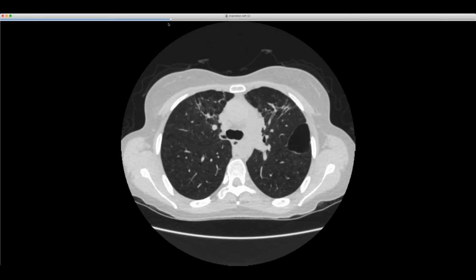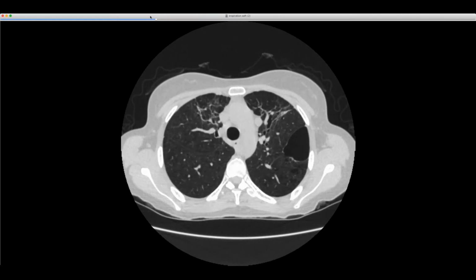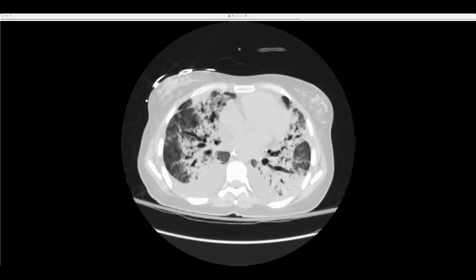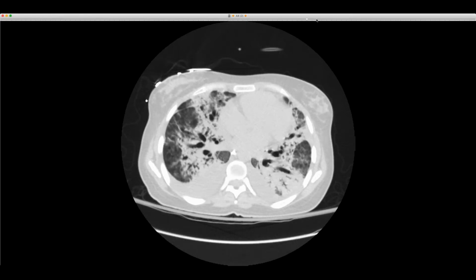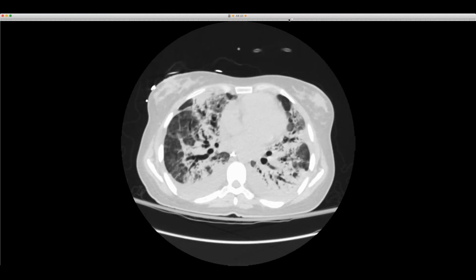It's interesting. I think the thing that for me favors ARDS is not only that clinically she had ARDS, but also look at the prior CT. In fact, in my mind it's kind of classic post-ARDS anterior fibrosis. But look at the bronchial dilatation that you had down here. We see many cases in which this... and the reason I'm not calling it bronchiectasis is that it returns to normal. Hey, I'm not seeing the old CT. Oh, sorry. Let me look at it. Yeah, so old CT.